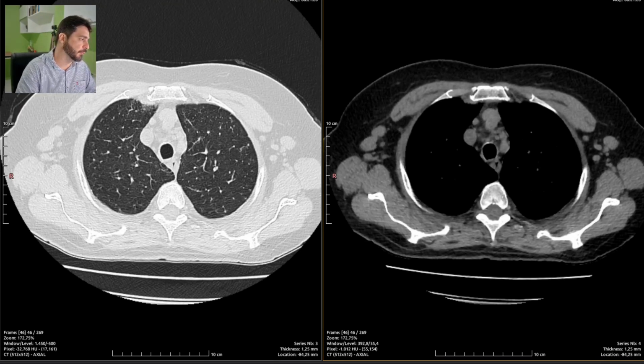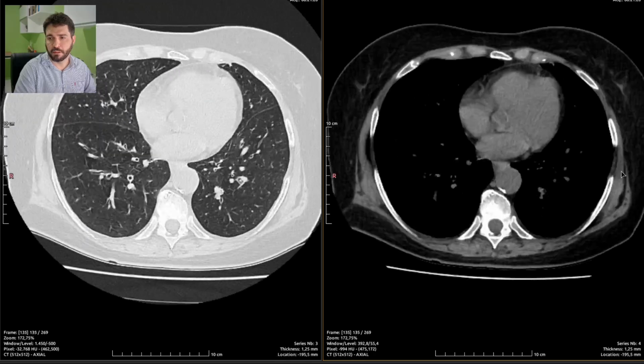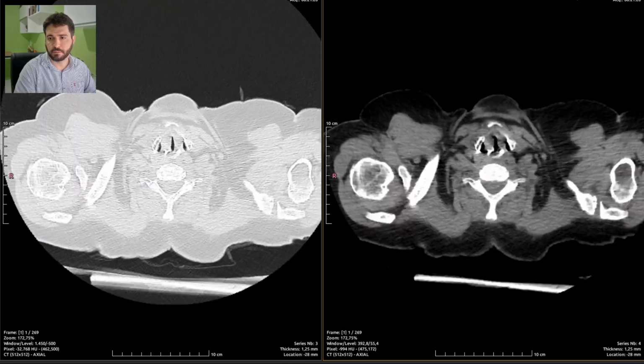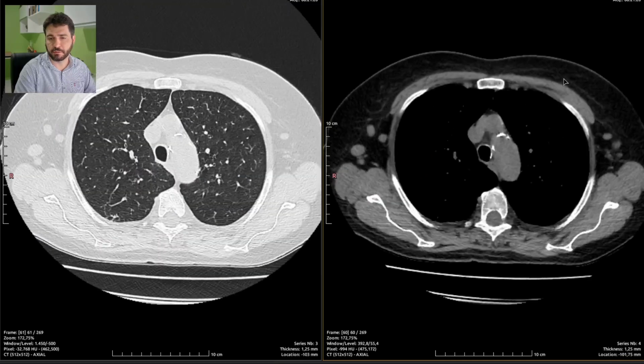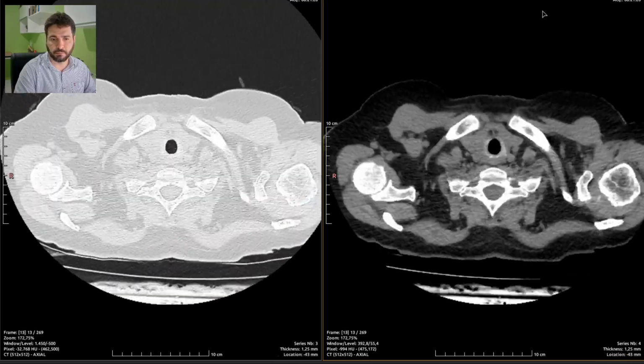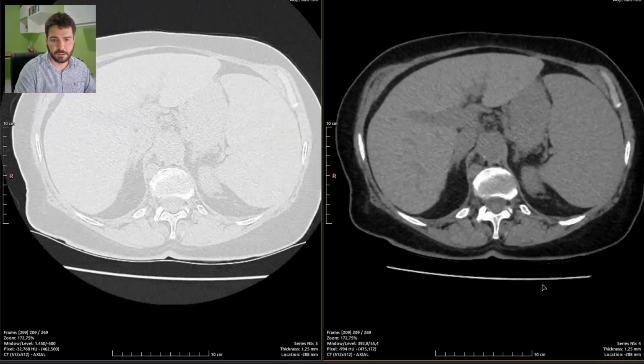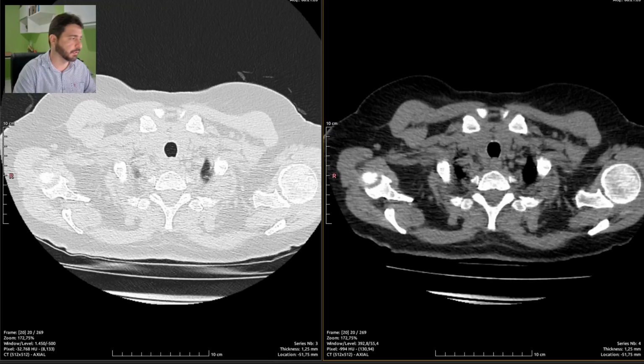So be sure to report these findings as a footnote on the report, so you can alert the referring doctor about the possibility of something much more severe than just irregular pneumonia on a chronic pulmonary disease patient. So COPD isn't the motive for this diffuse lymphatic disease, lymph node and spleen disease. There is no pleural effusion.